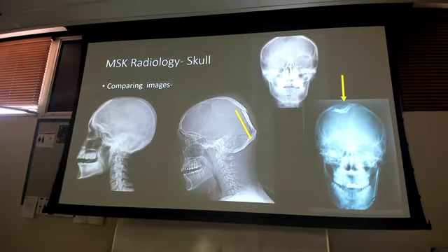Here are some X-rays. So you can see a depressed fracture. We can see pretty well on the X-ray. You can see the fracture here and here. The skull is supposed to be rounded, like this is my normal here. This is my normal. And then I'm depressed posteriorly. Or up here on the top, also depressed. Two different X-rays, both showing depressed fractures. So now you can see that he has one, but I also don't know the extent of that damage on just an X-ray. I just know he's got a depressed skull fracture. Okay?